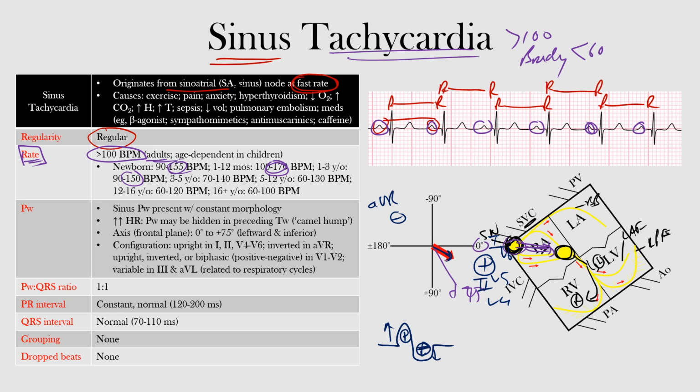Okay, so negative. And remember, the initial portion represents right atrial depolarization, the latter portion left atrial depolarization. That'll be important because V1 is an important lead that we look at when we look at atrial abnormalities. It's one of the short axis views of the heart and gives us a good idea of what's going on in the atria. All right.